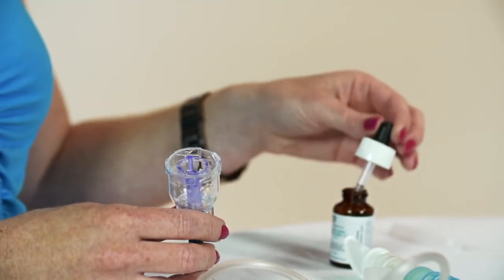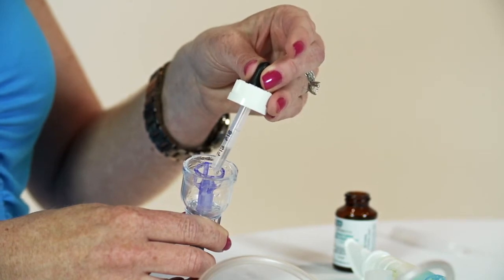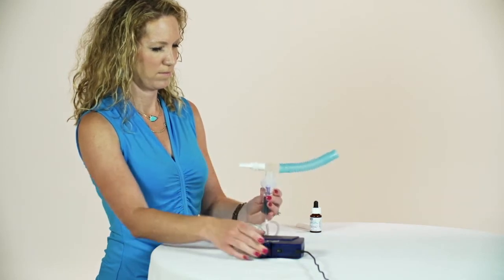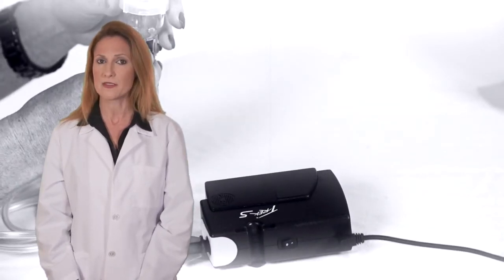A medication cup or reservoir is where the liquid medication will be placed. The nebulizer itself is usually in the top of the cup. Inside is a little dome or baffle. Either a mouthpiece or mask will be connected to the top of the cup. There's often a T-shaped tube from which the mist is exhaled. There is an air compressor which directs air through the medicine to form the mist. The thin plastic tubing connects the air compressor to the medication cup.